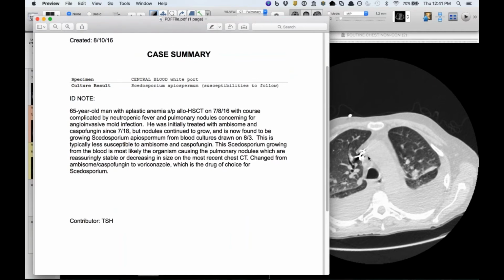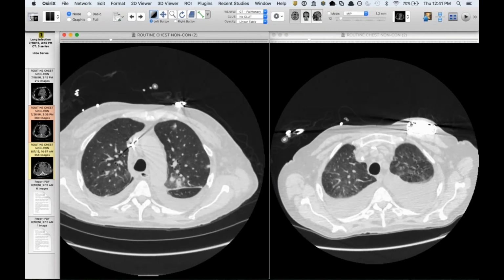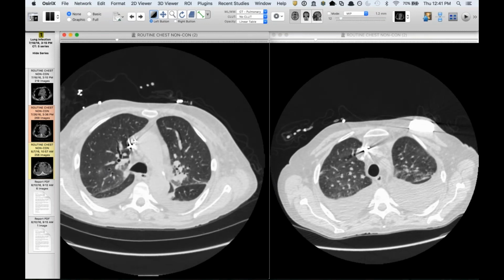Sorry, I was just going to say you couldn't make that diagnosis off the CT. I'm disappointed. Yeah, I know. Well, I was hoping that Jeff or David could tell me why it is, but I've never heard of that organism before.